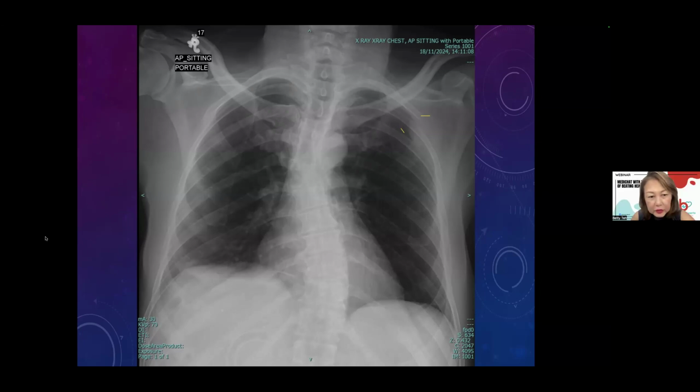Is the diaphragm over the right elevated? Right lower lobe mass consolidation. I guess you're talking about this, right? No, it's quite okay because of the rotated view, and plus the patient is having scoliosis. It's still acceptable. Normally, we will take it as abnormal if more than 2 cm different between the right and the left diaphragm, but this case is still okay.